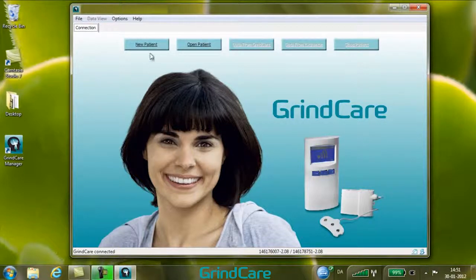The buttons on the main screen are New Patient. This is where you create a new patient. Open Patient. Here you open an existing patient file. Data from GrindCare. This is used for appending data from the connected GrindCare device to the active patient file.